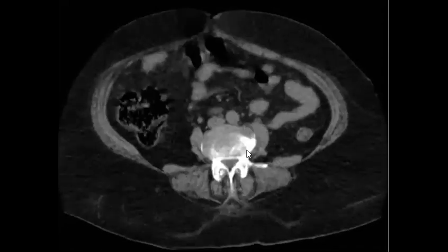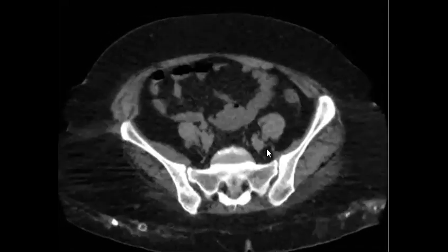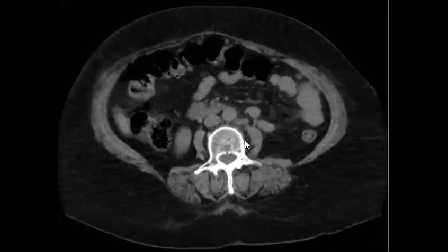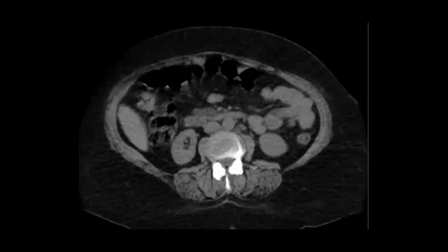So it can be indeterminate, but it looks like there are also some lymph nodes. If they have previous imaging, you check it and compare, especially if you have chest, abdomen, pelvis, or whole body. Then the best in this case is they request now a PET-CT. Okay.